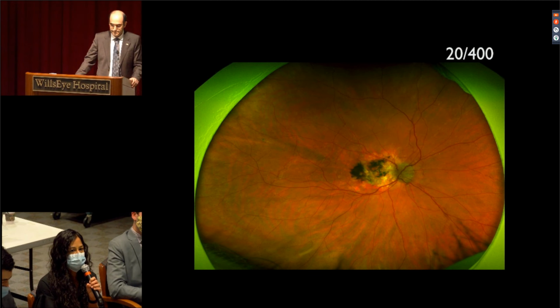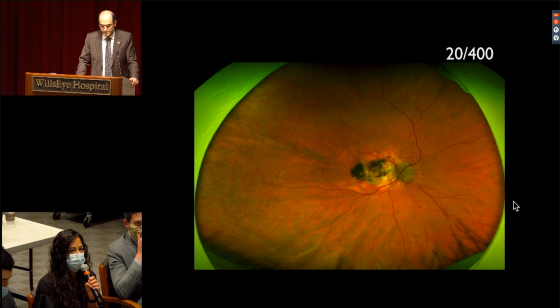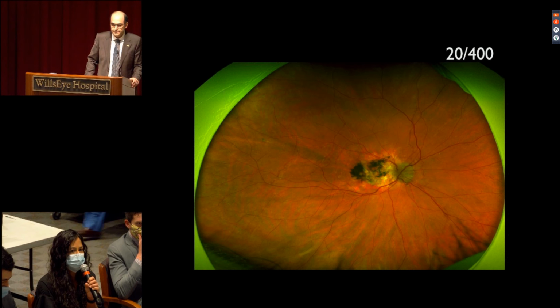It has a diffuse grayish appearance with scattered punctate hypopigmented lesions throughout. I don't see any hemorrhages themselves, and you can make out the margin itself. So hard to say if this is disc edema, disc drusen, or some type of melanocytoma of the optic nerve. Looking at the vasculature, it looks normal.